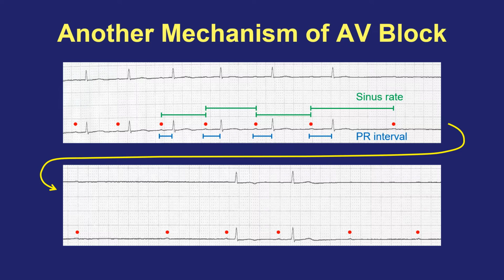The sinus rate suggests something's happening to the sinus node, which is up near the superior vena cava in the high lateral part of the right atrium. The PR interval suggests that there's a problem happening at the level of AV conduction. And with the PR prolonging the way it is, that's a typical Mobitz 1 pattern. You're talking about the level of the AV node, and that's down at the bottom of the septum at a very distinct, geographically different location.